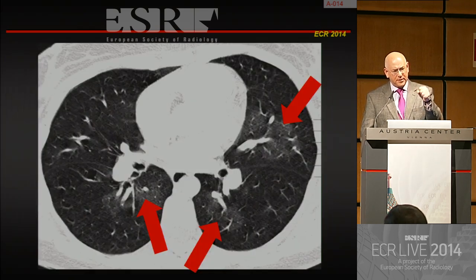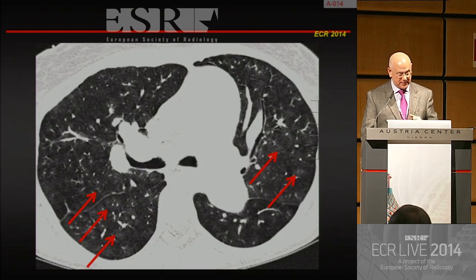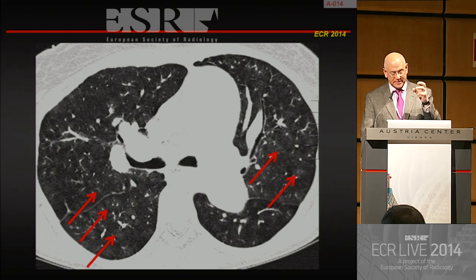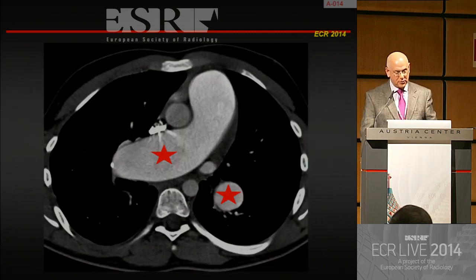Of course, the occlusion of the lumen creates perfusion differences, perfusion heterogeneity in the lung parenchyma that reflect in different densities, different attenuation values of the lung parenchyma. Sometimes, especially in patients with plexiform lesions, these heterogeneities can have ground glass nodule-like appearance that are distributed diffusely throughout the lung.